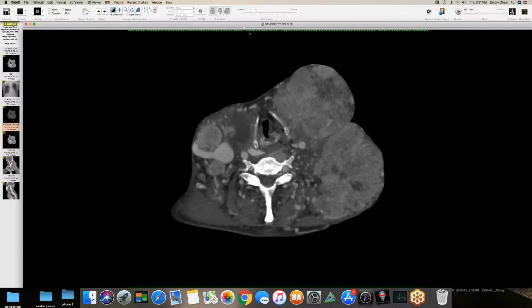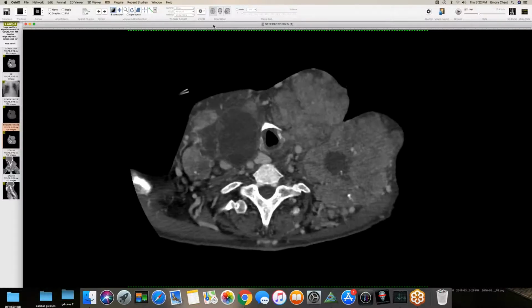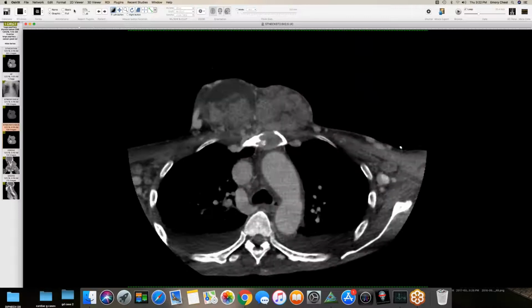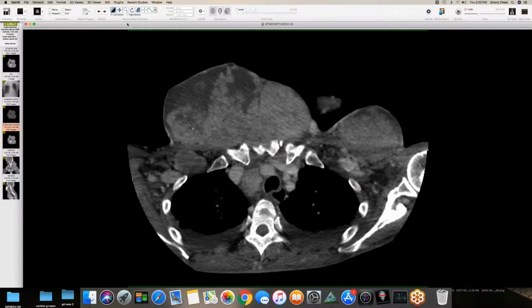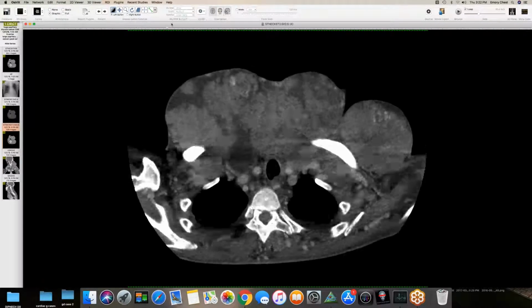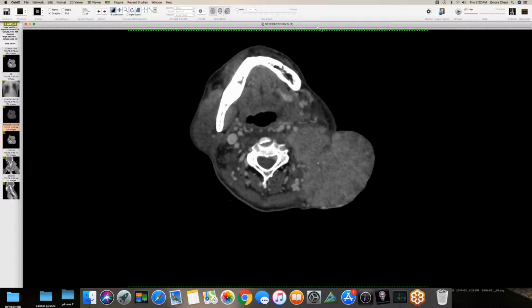Believe it or not, this was a papillary thyroid carcinoma that was locally, aggressively spreading everywhere here within the neck, and you can see that the adjacent manubrium and upper sternum are involved here. It's narrowing vessels, which is why we saw the collaterals. You have multiple necrotic-appearing lymph nodes here and soft tissue deposits. And you have an invasion into the spinal canal.